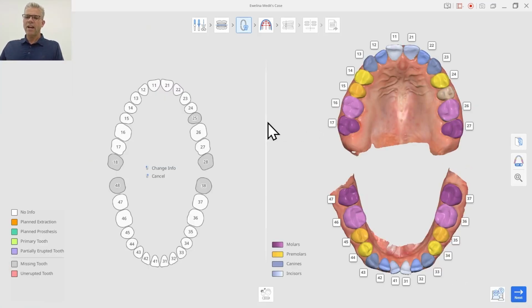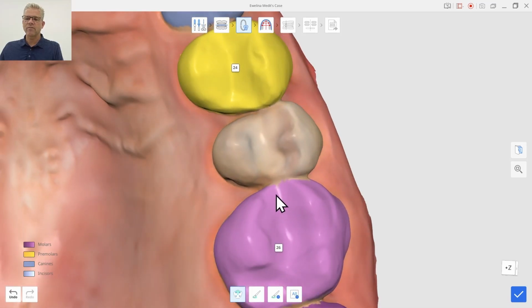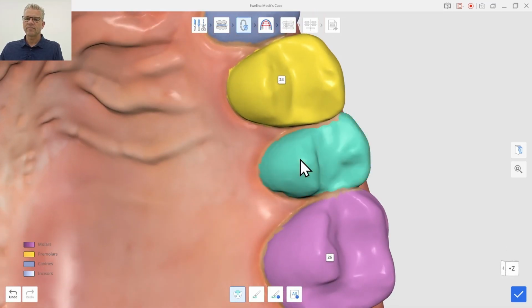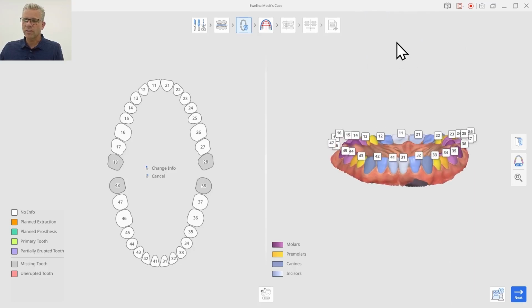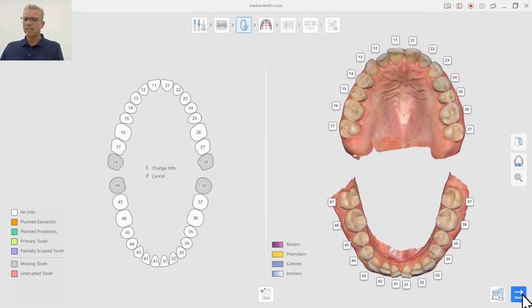Now to get the 5, I have to come over here on the left and click this grayed out tooth and say Find Teeth, and double click on that tooth, again using the Tooth Finding Wizard. Let's erase all and see if we can change the angle a little bit and get that to select just this tooth. There we go. And we'll confirm that. And then looking at the lower arch, it looks like everything is numbered correctly. So we'll move on to the next step.